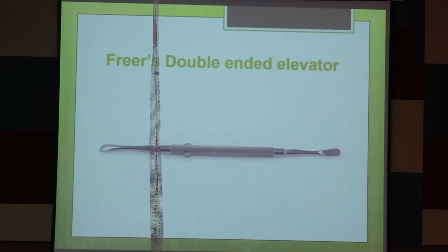Okay. So, another instrument. This instrument is used in nasal surgery as well as in ear surgery. Okay? Remember the name well. This is frequently asked. It's Freer's perichondrial elevator. Freer's elevator. Okay? Mostly we use it on the perichondrium, sometimes the periosteum of a bone or cartilage. Right? Perichondrium means chondrium, cartilage covering. Periosteum means the covering of bone.